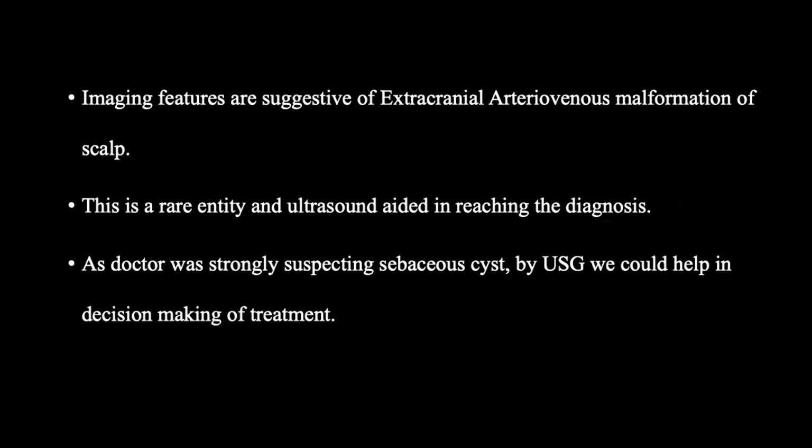So my diagnosis was an extracranial arteriovenous malformation of the scalp, which is again a rare entity. And ultrasound helped us in reaching the diagnosis. The doctor was strongly suspecting a sebaceous cyst. By ultrasound, it completely changed their decision and treatment making.